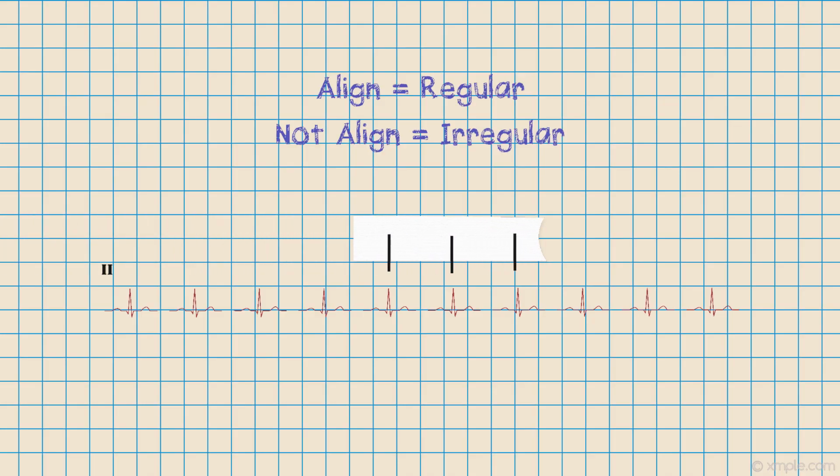So in this video, we've gone through the basic physiology of the heart. We know it has 4 chambers and it pumps blood around the body. We understand what a P wave is, we understand what a QRS complex is, and we understand what a T wave is. We are now able to calculate the rhythm and the rate of an ECG trace. In the subsequent video, we will look at the different types of heart blocks to get a greater understanding of how these things work. But for the beginning, I think this is enough.